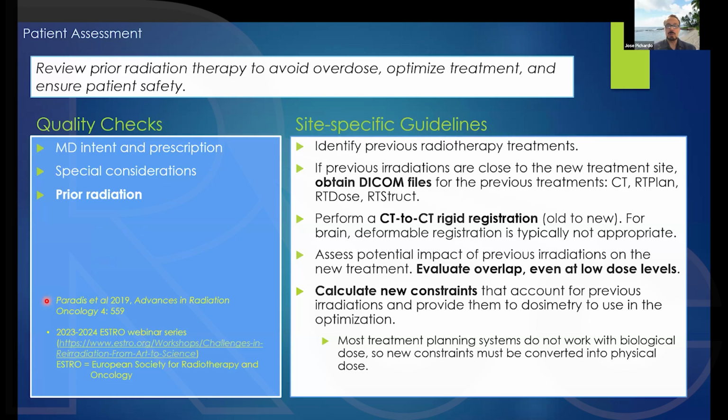And maybe you're trying to relate doses to areas where the previous treatment was done with a CT where the brain did not have surgery, and then the second treatment was done after surgery. So in such a case, the brain doesn't look the same in the two images that you're trying to add. In a situation like that, you might have to use deformation.